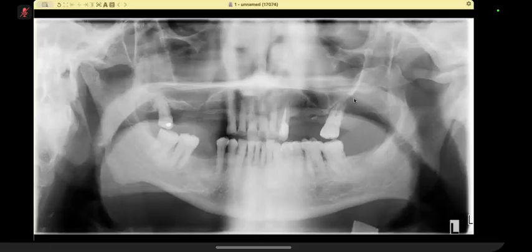Okay. So till now, what are you worried about? What will be your differential on this OPG? Sir, on this OPG, there appears to be an ill-defined lesion. There's no evidence of any white zone. It appears to be an aggressive lesion, and a further evaluation with a CT would be required to look for the extent of the lesion.